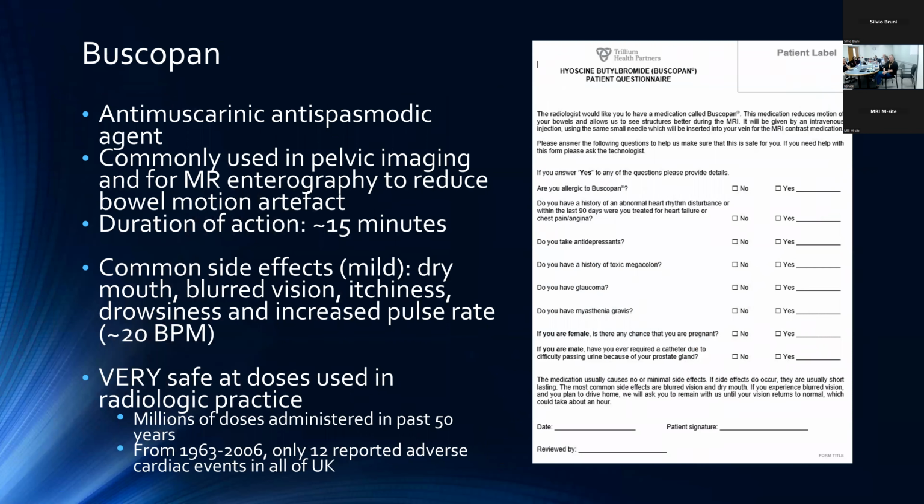So that essentially wraps up the discussion on planning of MRIs. So to just kind of wrap up the talk, I wanted to quickly discuss a couple of additional things that we commonly encounter in body MRI that can quite substantially impact image quality and interpretability.